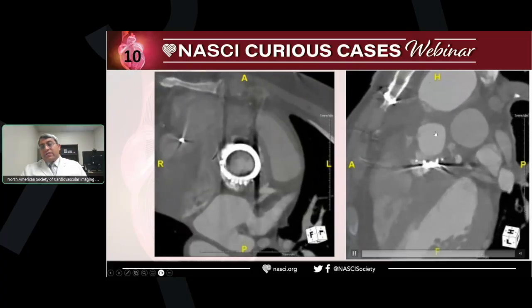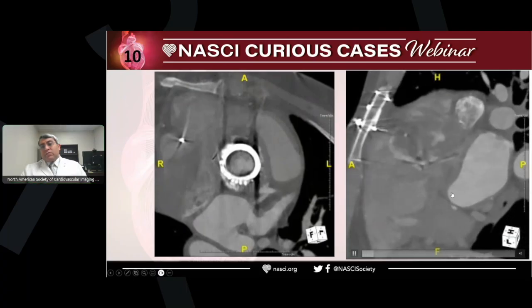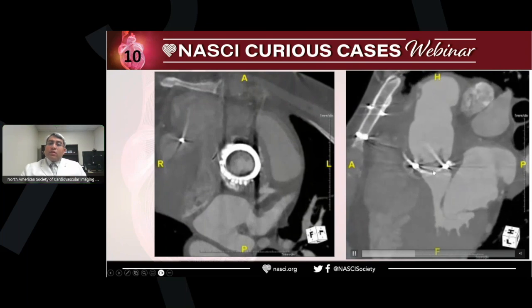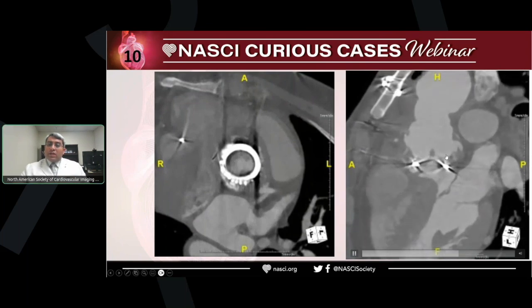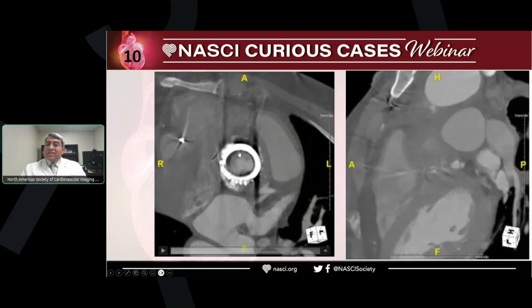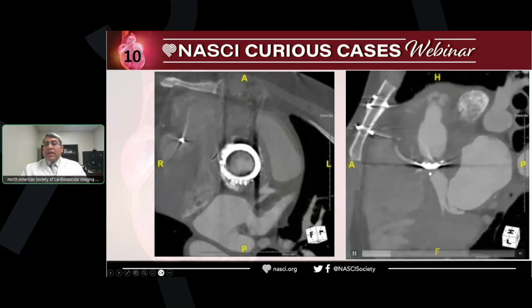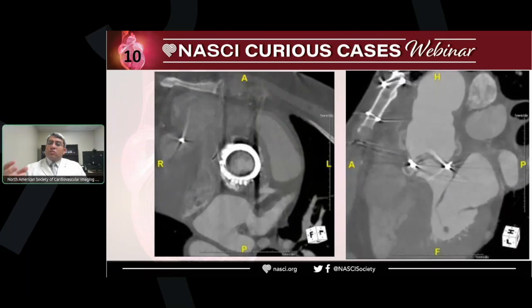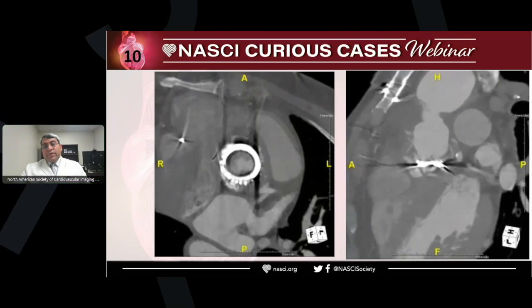So this patient has ascending aortic aneurysm repair with aortic valve replacement. Then this patient presented with chest pain following surgery. I don't remember exactly how long he had this pain. When we did a CT, as you mentioned, there is thickening in the bioprosthetic valve leaflet, and comparing pre-contrast and post-contrast, we saw some contrast around the aortic valve.